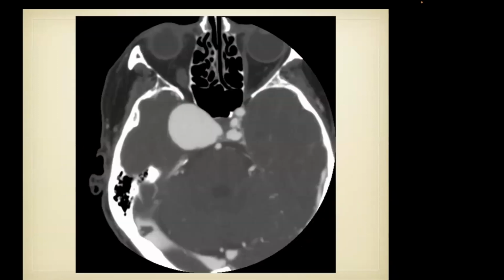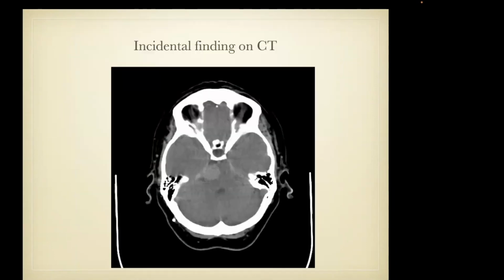The patient went on and had a CTA. CTA is not sensitive for flow velocity. It just shows you where the enhanced blood accumulates, and this patient has a giant carotid aneurysm. So again, flow-related enhancement is flow velocity dependent on 3D time of flight imaging. So if you don't see something appear bright on MRA in the head, it could be because of slow flow.